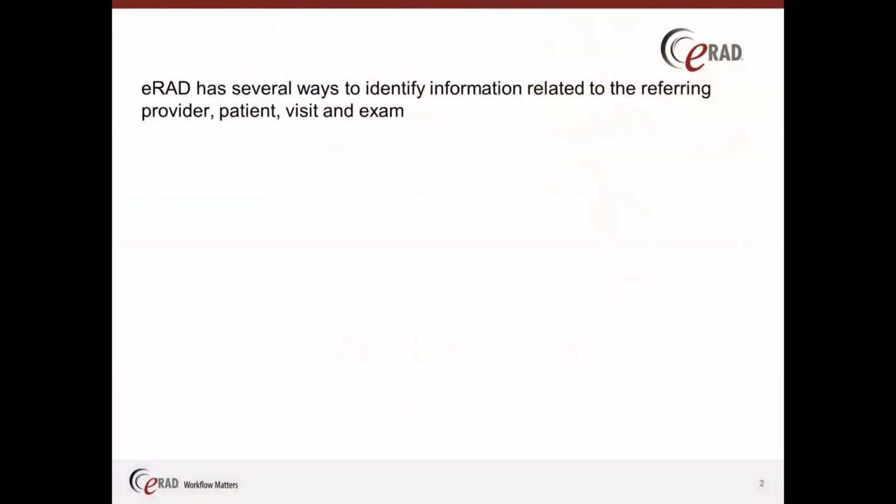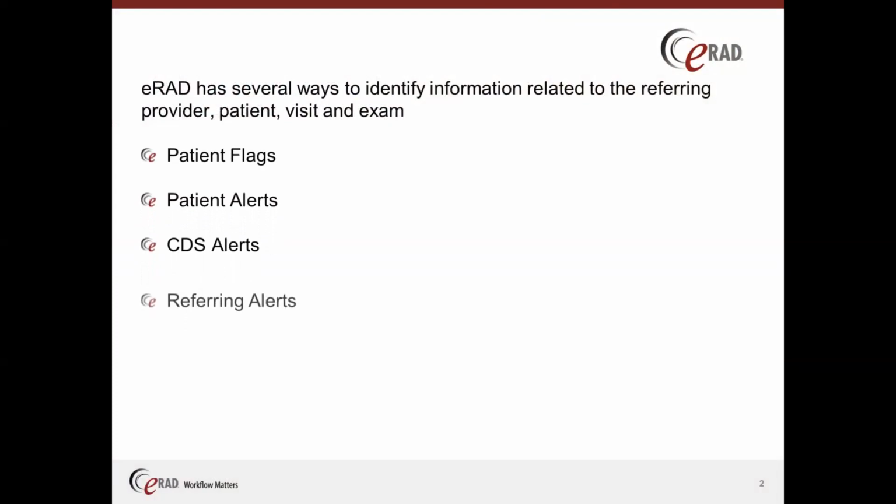eRAD has several ways to identify information relating to the referring provider, patient, visit, and exam. The first one that we're going to talk about today is patient flags. The second category is patient alerts. Then we have CDS alerts, referring alerts, and insurance carrier alerts.